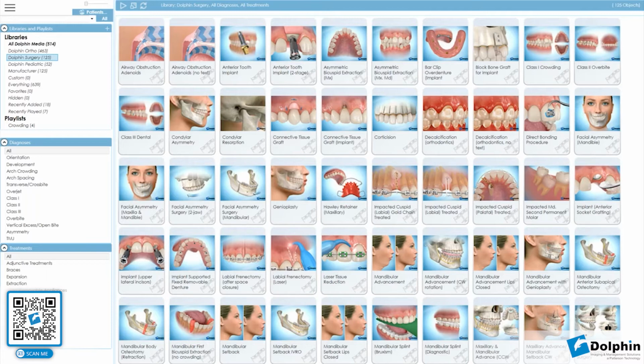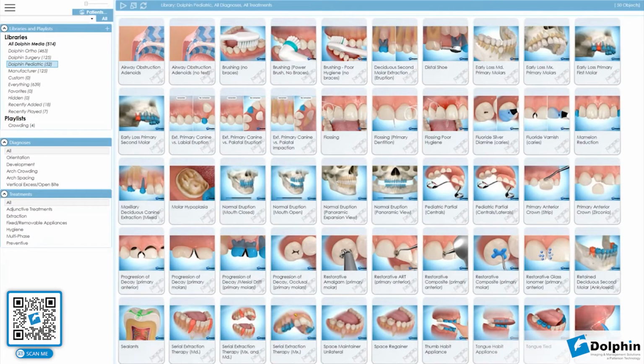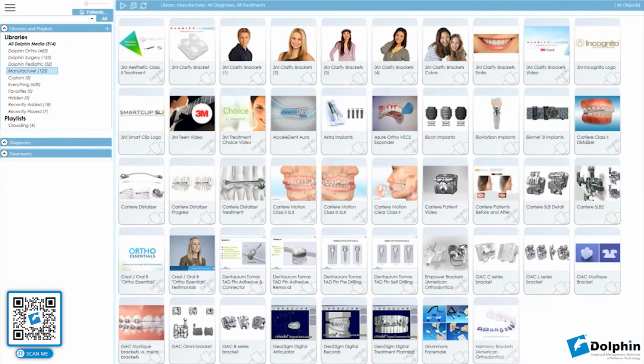So it's a little bit of a downgrade of Aquarium. And we do have pediatric videos as well, which is great for our multi-specialty practices. And we do allow manufacturers to provide content as well. So if there's a manufacturer company out there that would like to provide us a video, they are more than welcome to send those videos to Dolphin, and we'll make sure to implement that in our software. So you as a user can show a particular bracket or an Invisalign video, something to play in your waiting room. Those are all great and are allowed here as well.